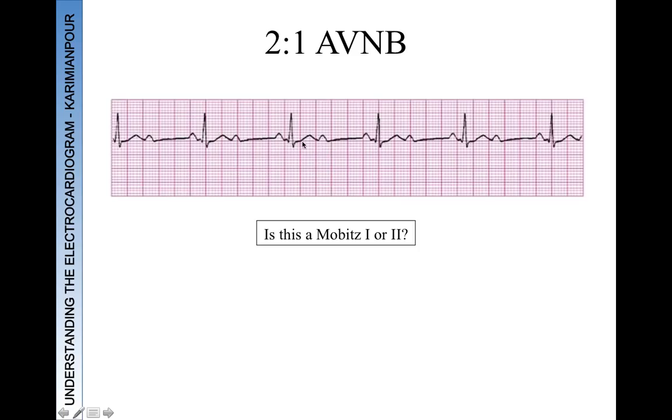Is it a complete heart block and the P waves are marching through, and it happens that the rate of the ventricular or junctional escape rhythm in this situation matches the rate of the atrial activity by half so well that you don't see P waves falling on top of the QRSs and the T waves? So there are things that you can do to help you differentiate the rhythm, obviously.